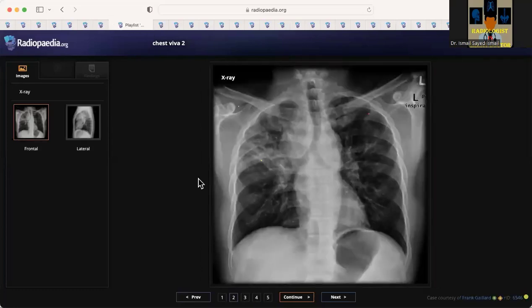So do you want to take this one? Yes, candidate 3. Okay. So this is a chest radiograph of an adult male patient, where I can see that there are parenchymal consolidation changes involving the right upper zone with air bronchogram. And apart from that, I can see the right paratracheal soft tissue is appearing widened. Bilateral lower paratracheal soft tissue is appearing widened. And there is mild widening of the carina. The right bronchus is appearing relatively horizontal, probably due to some underlying fibrosis in the right upper lobe.